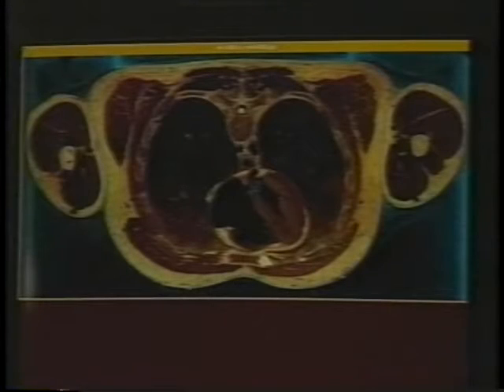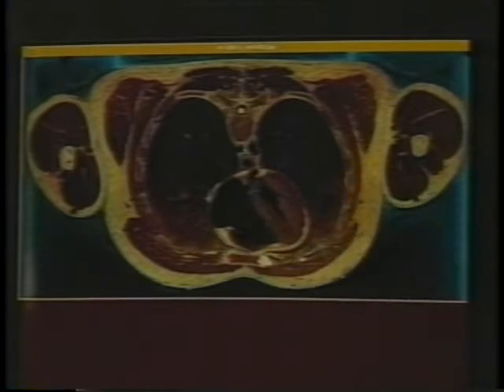The NLM is in the process of creating a large data set of anatomical images of a male and female subject. This database includes MRI, CAT scans, and cryosections, which are digital photos of axial sections. For example, this is a cryosection image from the area of the chest. We can see the 2 arms, the spine, the heart, and the lungs. This image requires about 7 megabytes of storage space.